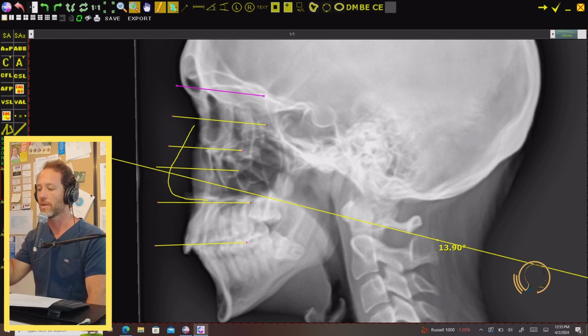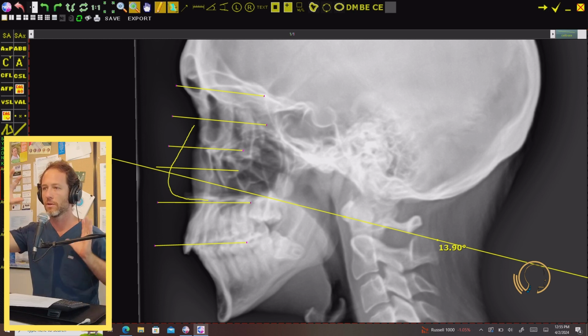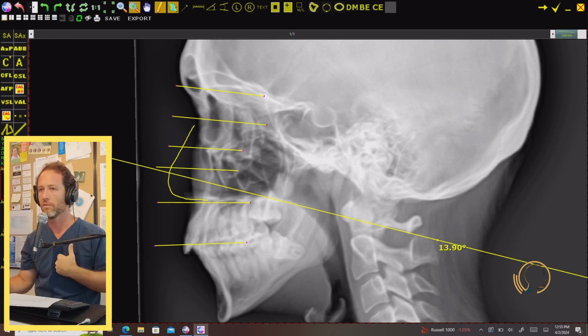And that's going to tell me where that collimator light, that central ray, is going to line up in crosshairs on the facial feature. And I will have turned the tube to 14 degrees. So in this case, we'd be looking at S2 effectively at 14 degrees. So that's how I'm going to shoot that frontal film.